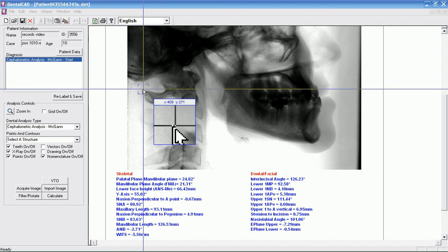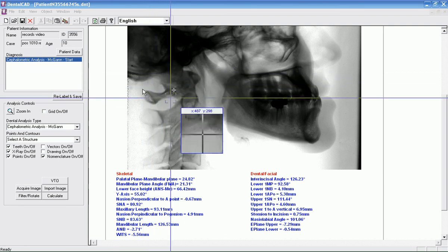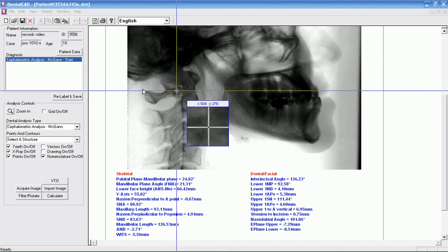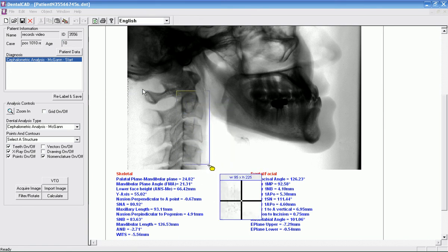That's my hotkey, and it starts the program. Now, I move it around without putting my finger on the left mouse key. And when I have it where I want it, I press it down and I drag, holding down the left click key, I drag a box around what I want the picture of.